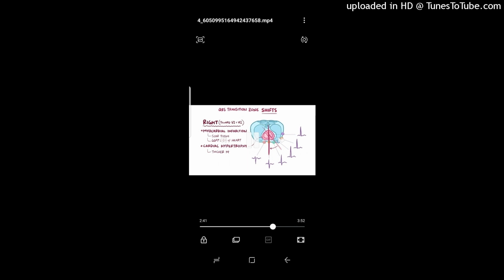Normally, atrial depolarization produces a pretty normal-looking, symmetric P wave. In right atrial enlargement, all that extra right atrial muscle tissue results in a large P wave in leads V1 and V2, often over 1.5 millimeters, as well as in the inferior leads 2, 3, and AVF, often over 2.5 millimeters.